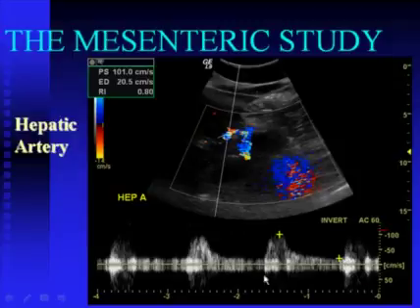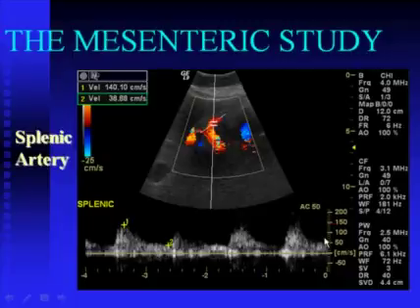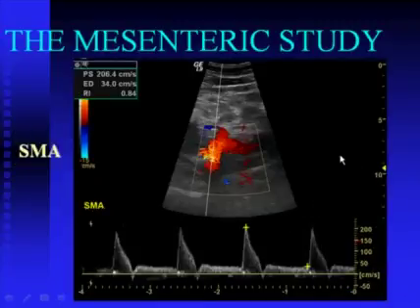And you can tune out mentally all of this noise and other aberrations and focus on the important parts of the waveform and the overall characteristics of the waveform itself. And again, an example of a splenic artery, again showing good systolic upstroke, good sustained diastolic flow. And the presence of this kind of noise and interference really is immaterial as long as you have a good waveform to work with on the arterial side.